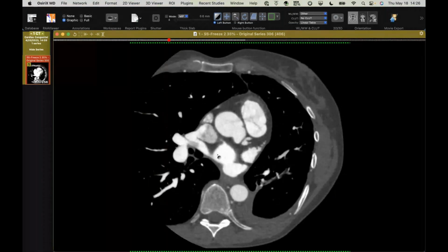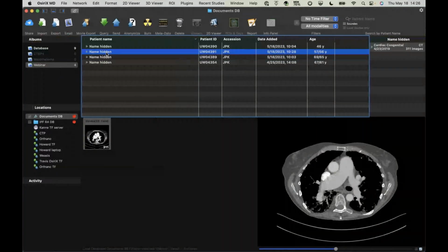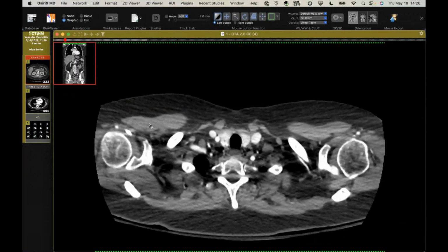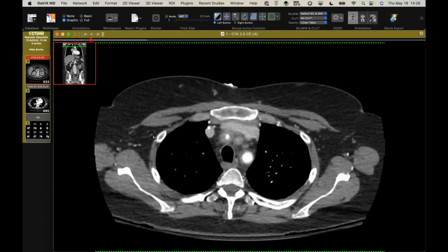There's no other anomalies with it. So two sinus venosus type ASDs. This is another neat pulmonary vascular case. So this lady is 56, and you can see she has already abnormal vasculature.